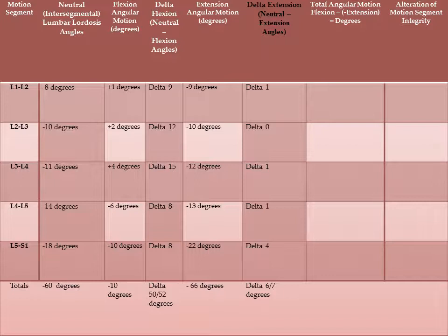So what would you conclude here? I conclude that there's relative immobility of the spine in moving from neutral lateral to lumbar extension. In fact, one of the motion segment levels at L2, L3 demonstrates 0 degrees of motion.